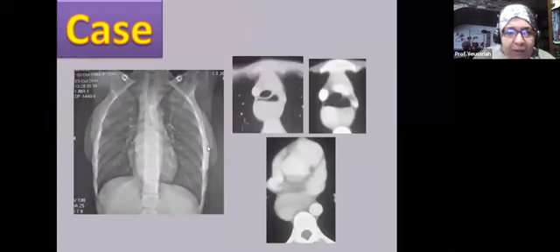Now, regarding the CT, we can see another case of achalasia. We can recognize in the scanogram the retrocardiac dilated esophagus, which ascends upwards on the right side, and the axial imaging showing fluid levels in the upper cuts and fluid containing dilated esophagus in the lower cuts.